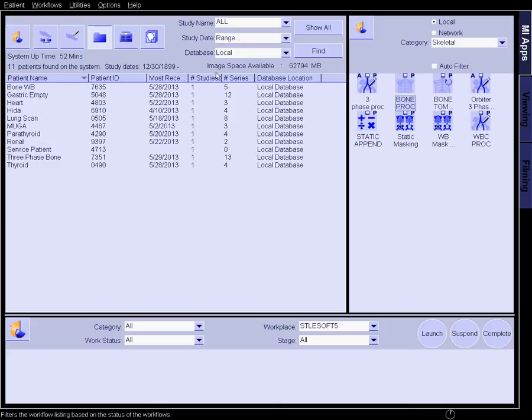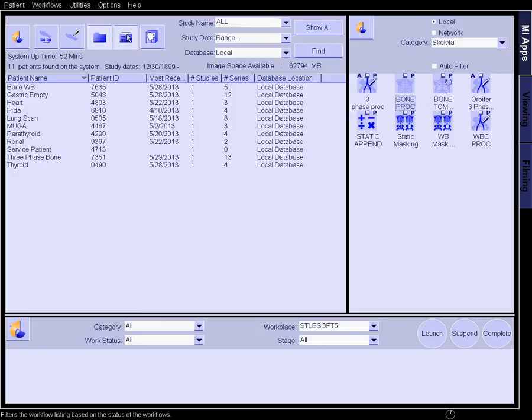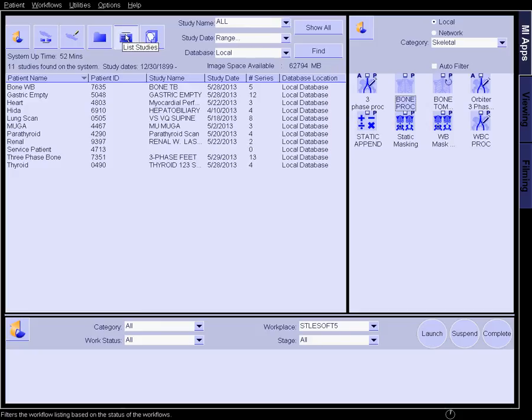This lists the patients. As you can see, it's depressed, and those are all the pictures. It lists all the patients in a very small, compact way. List studies basically replaces the date. See how it just changes it there? Most people leave it on list studies because list patients doesn't display what type of studies they are. Unless you're on a really tiny monitor, that's the only time you would need to use this one. So you're going to really toggle between these two.